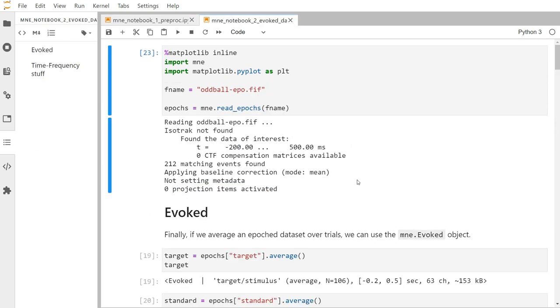I will show you different ways that we can use MNE to visualize the data. This will be very helpful to reproduce all those figures and graphs that we have covered in the lecture. It is also important to gain some insight into the data for exploratory data analysis, visual inspection of the EEG data, and possibly generating high quality figures for your reports. Today I will be using the Jupyter Lab IDE for demonstrating all those visualizations.